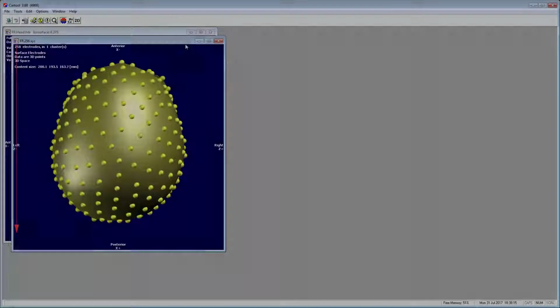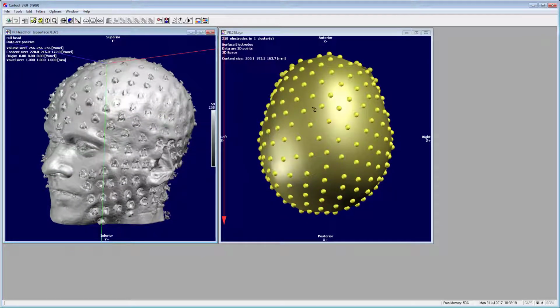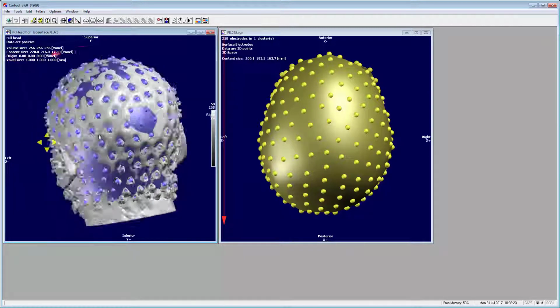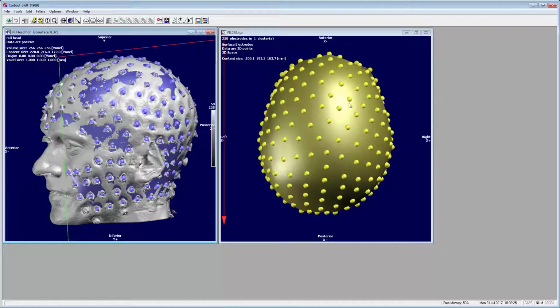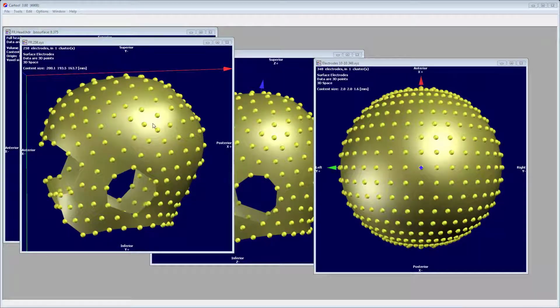The goal of this tutorial is to set up the electrodes coordinates that can be used for a given subject, like displaying topographies or computing inverse solution matrices. I will show you the three scenarios that you can encounter by order of preference.